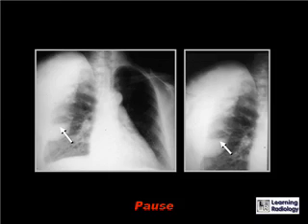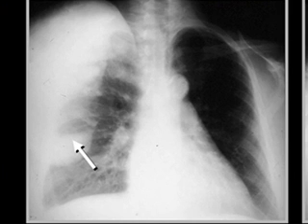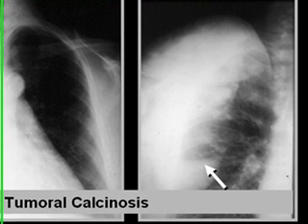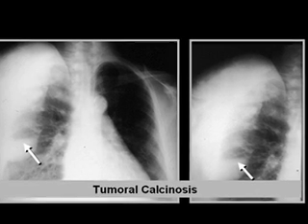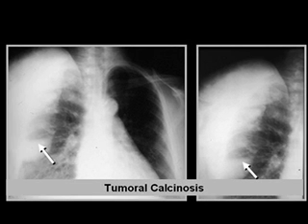You're looking at a close-up of the right shoulder in a patient who has a chronic disease. What is your diagnosis? This is the tumoral calcinosis that's associated with chronic renal disease. There is a dense, white, flocculent, tumor-like mass that is associated with the right shoulder joint, and this patient was standing up for an upright chest x-ray, and the white arrows are pointing to a fluid level where the calcium has come out of suspension and settled at the bottom of the cystic mass.